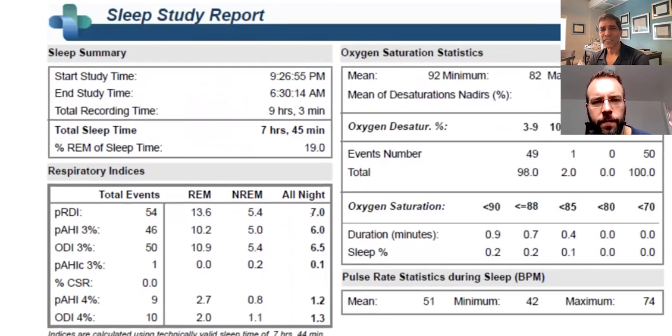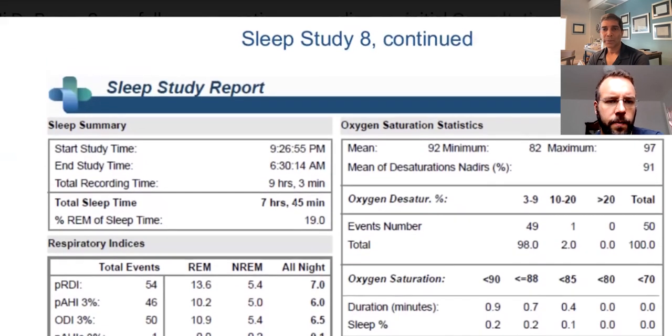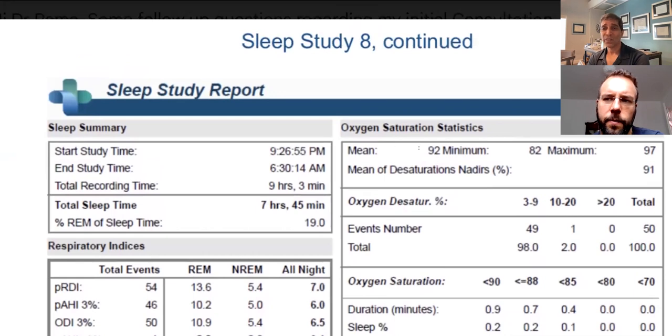Just mild. Everything's hugging. In REM sleep, a little bit worse, 10 to 13, right? The AHI and RDI. Mean oxygen is awful. So the other question is, is it real? Was it just a bad sensor, right? But if that's real, that's not ideal, right? That is low. But we don't know if that's real or not.